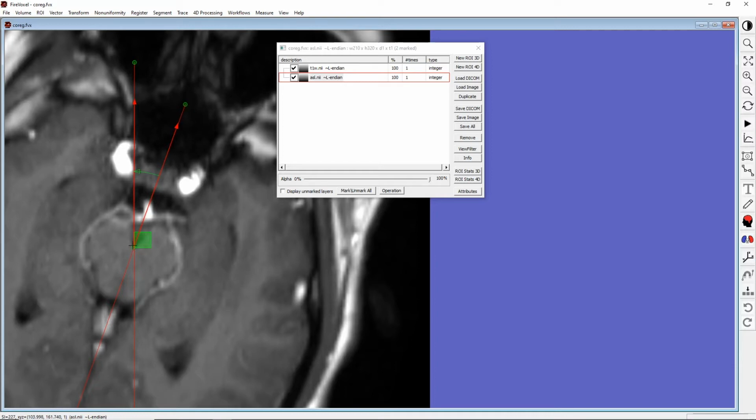To adjust the sector, click on it and drag each control point individually. To move the sector, right-click on it and drag it to a new location. The angle of rotation is shown next to the sector and is about 19 degrees. The direction of rotation is important and indicated by an arrow.